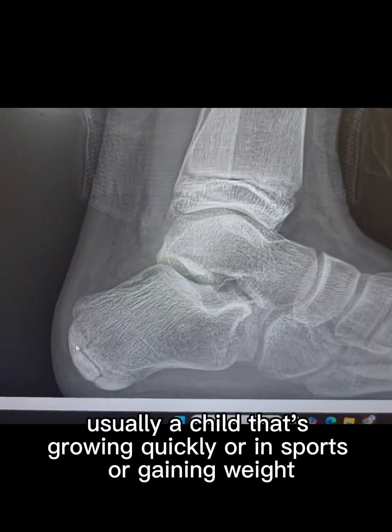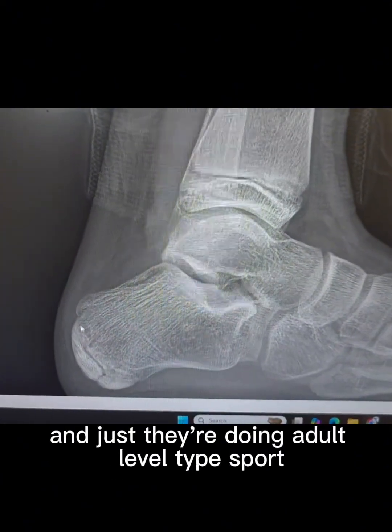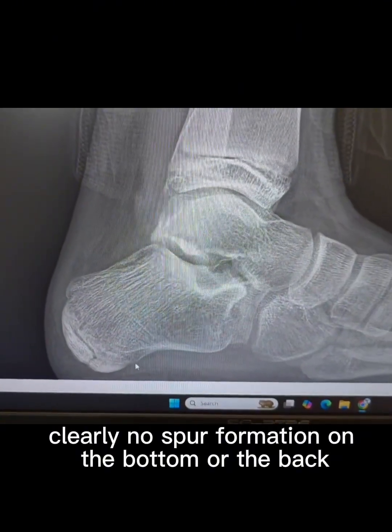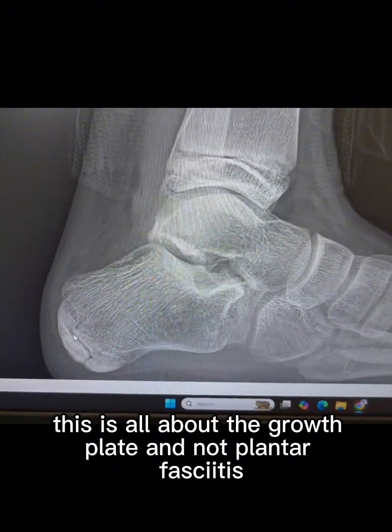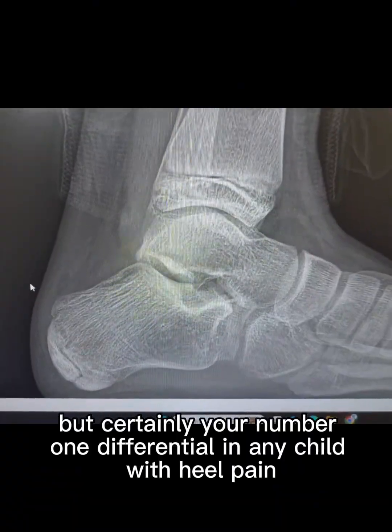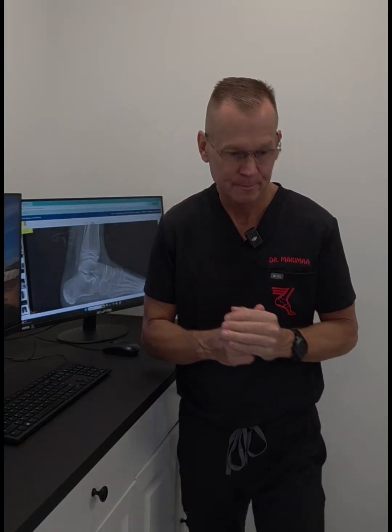Usually a child that's growing quickly or in sports or gaining weight, and they're doing an adult level type sport, and a little kid's growth plate can't handle that type of stress. Clearly no spur formation on the bottom or the back. This is all about the growth plate and not plantar fasciitis, but certainly your number one differential in any child with heel pain. So I've got lots more examples that we'll run through now.